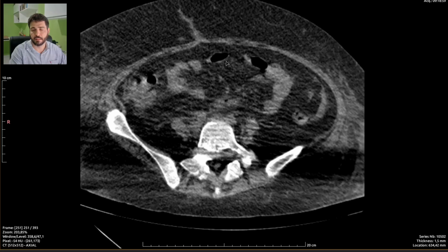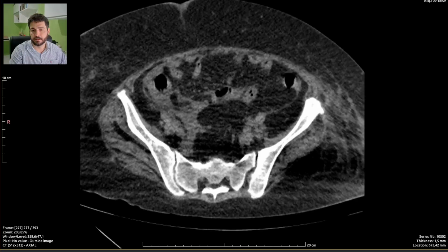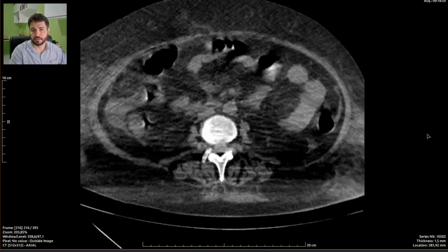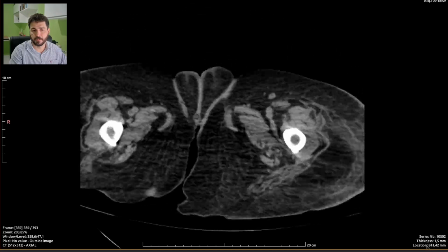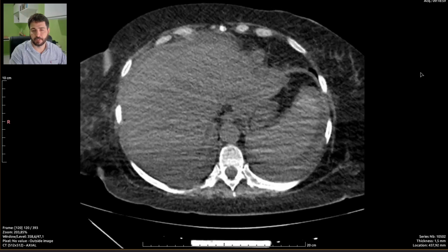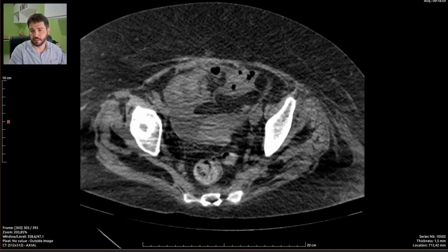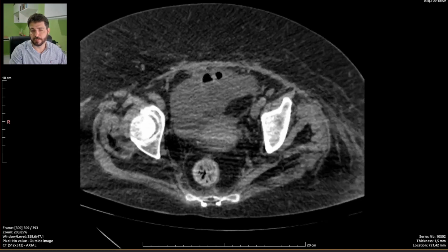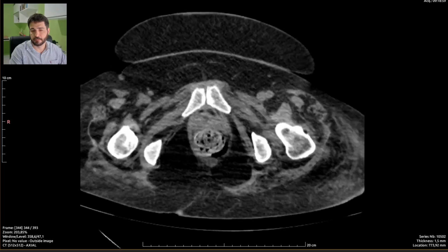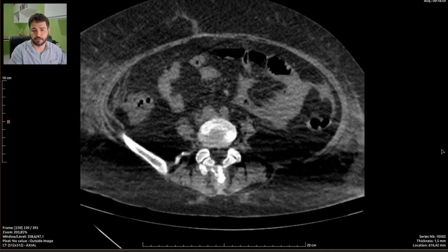There is a scar of a longitudinal median incision. Can't really tell much more than that. There is an atrophic uterus. Rectum is a rectum, not much.